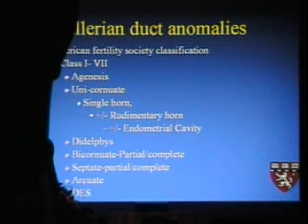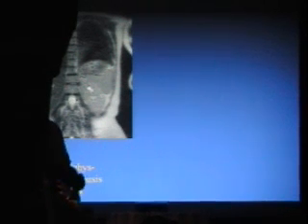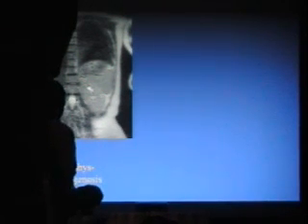Arcuate and the DES, remember that they're in this group, but neither of those are surgical cases. So let's look at an example of a uterus didelphys. The first thing to remember is always, of course, image the upper abdomen. You must look to see if there's an associated genitourinary abnormality. The most common will be renal agenesis.